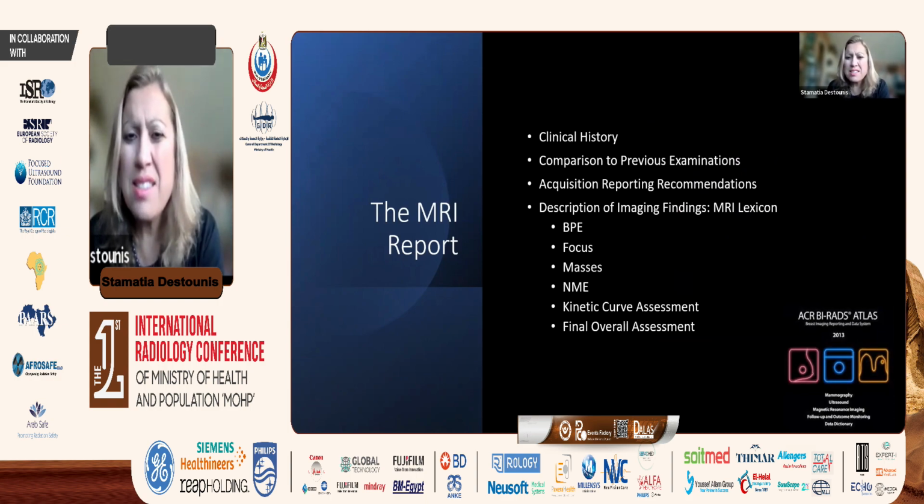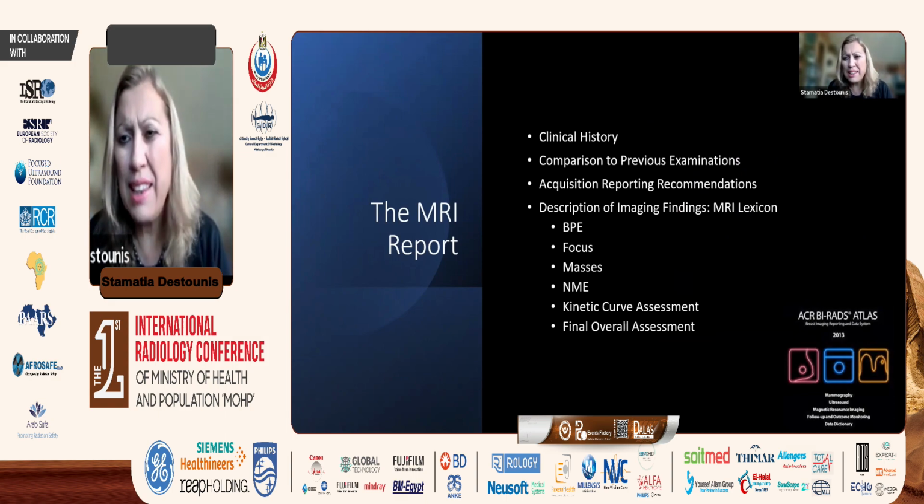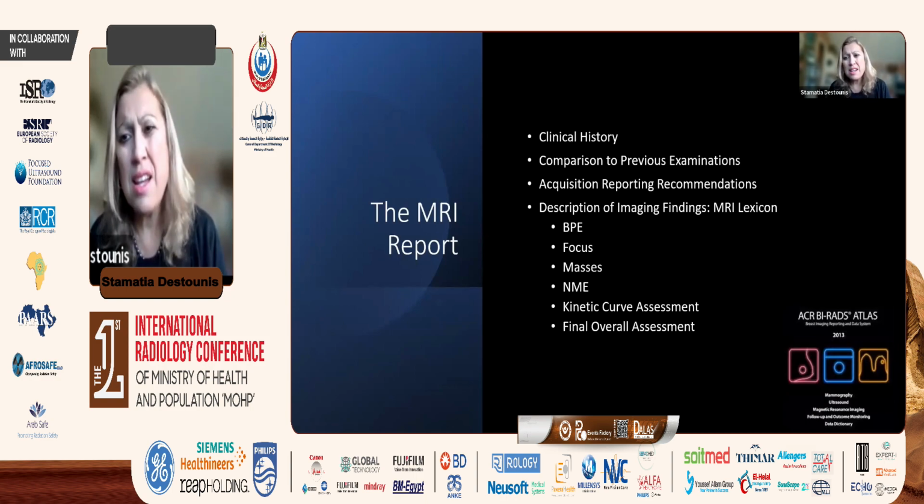We need to discuss the acquisitions that we obtained the MRI study with, and description of the findings. We're utilizing the current MRI lexicon, which at this point, the 5th edition is the lexicon that we have out, our ACR BI-RADS Atlas from 2013.